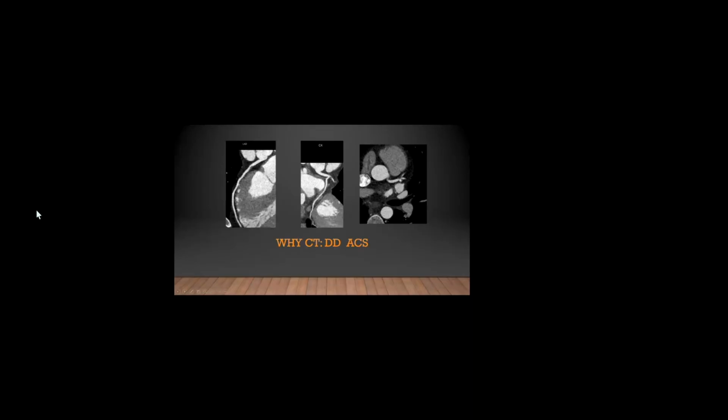And at the distal left main, ostium of the left anterior descending, we could see this opacity. So that is a normal healthy artery, but we could see this irregularity here. That is most likely, in an acute setting, a hematoma on top of a dissection, but this time it is in the coronary. And sometimes they heal by themselves. So this patient was, for example, asked for a follow-up in 3 months. So CT differentiated that this is not a dissection of the ascending thoracic aorta, sending the patient to theater. Now that it is in the coronary, we will wait and see.